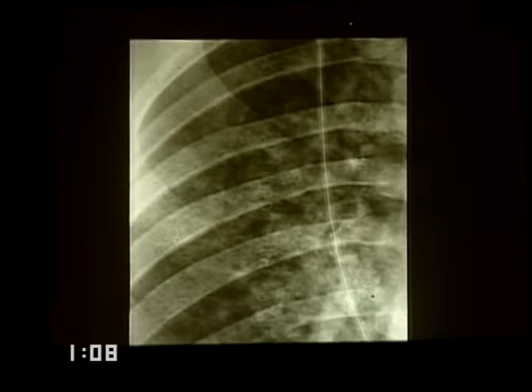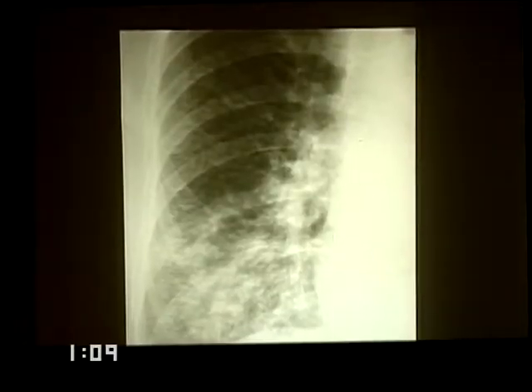In someone with bronchoalveolar cancer, one can see also some alveolar units, this one almost entirely filled, others filled to a lesser degree, with what I might call bleeding from one to the other. That is because of the leaky characteristic of the airspace. As the disease evolves, we get a situation where the nodules become almost invisible.